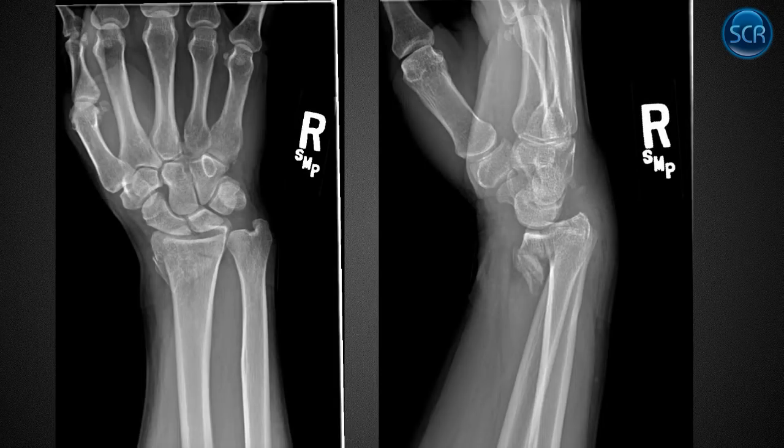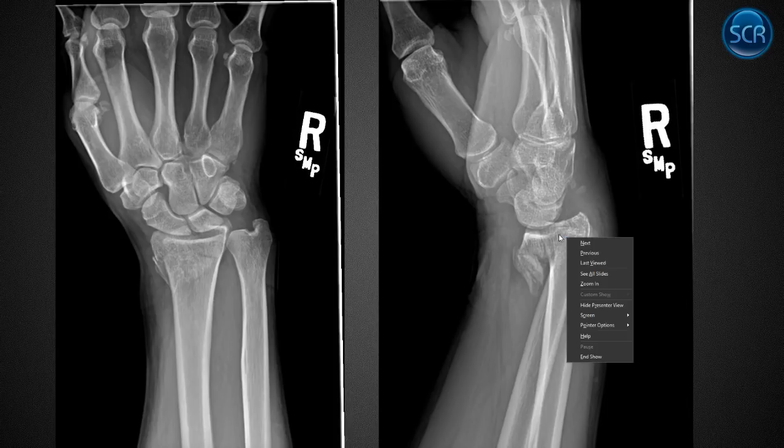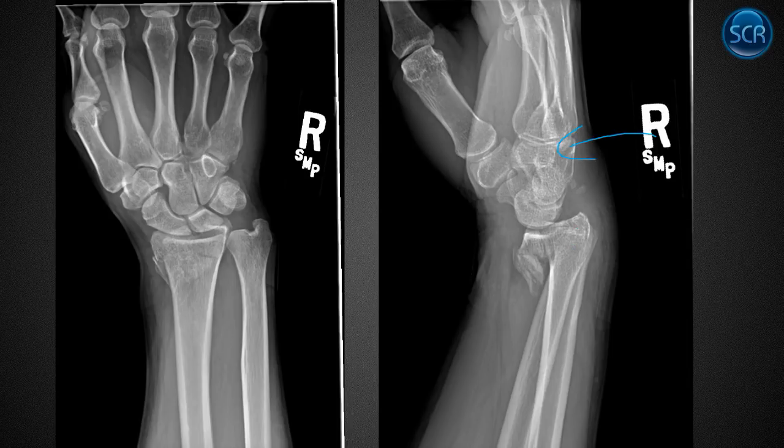And so compare and contrast that with a Smith's fracture. So this is a fracture of the distal radius as well. It's a fall on an outstretched hand, but your hand's not straight in front of you. It's like you're carrying boxes and you tripped. And so you're hitting the back of your wrist and it's forcing it up like this, and that fractures it and causes this anterior angulation. Okay, so this is fractured anteriorly, angled anteriorly, I should say.